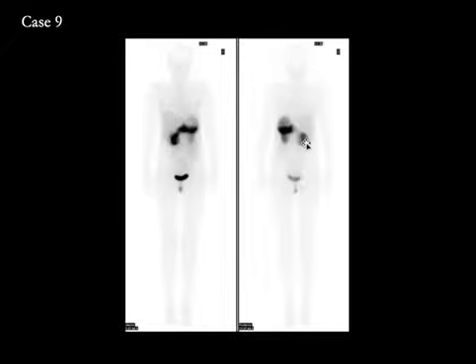So those are some of the common patterns that you may encounter when you are reading the indium-111 octreotide studies. Newer PET agents are available to evaluate neuroendocrine tumors, such as gallium-68 labeled dotatate, and with those agents we do a PET CT scan, as gallium-68 is a positron emitter, and they are much better as compared to evaluating those patients with indium-111 octreotide.